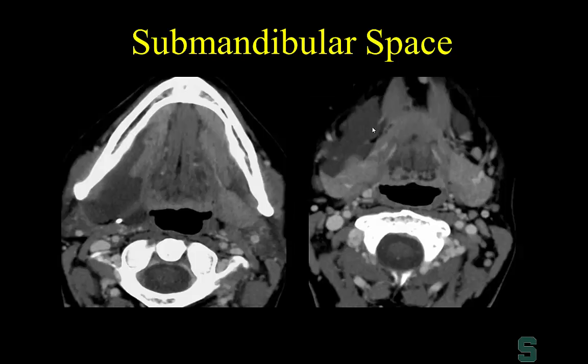And the last thing that we'll talk about is that here is another ranula, right? A little cystic lesion involving the lateral aspect of the sublingual space. And look how this ranula is now extending into the submandibular space. Remember I told you before in head and neck we take the same piece of anatomy or the same process and give it different names. Well, this type of ranula that extends deep to the mylohyoid muscle has 3 names to it. And that's why people get confused.